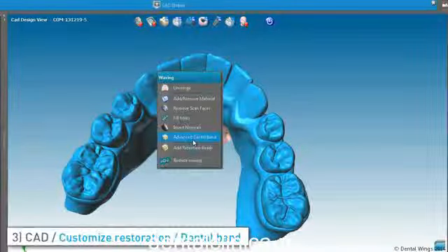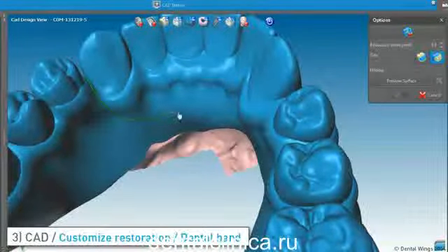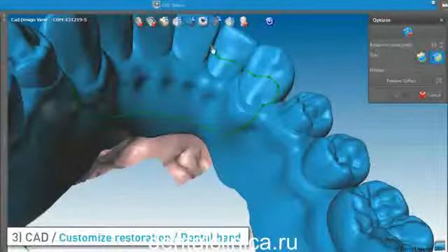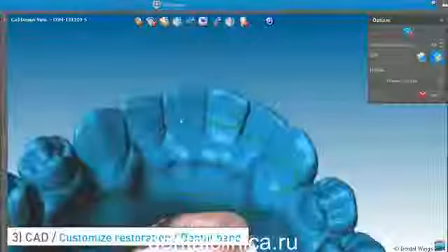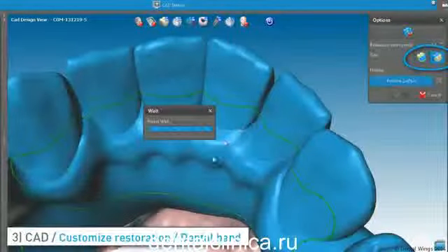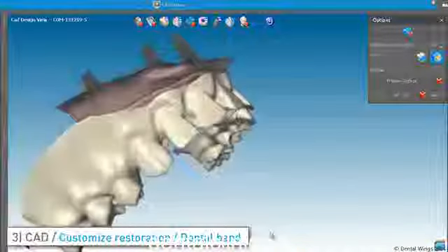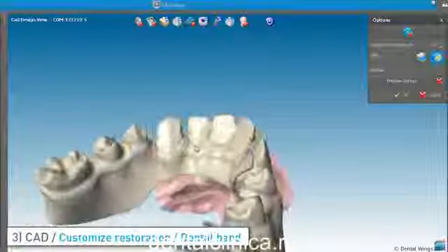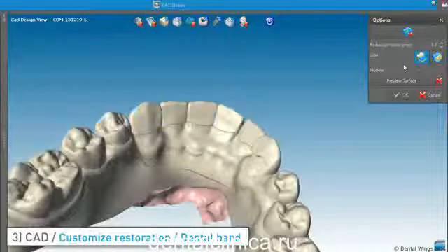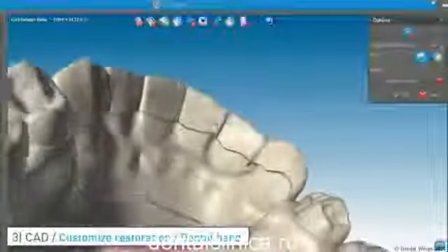Here is how you can apply a dental band to a merged waxing. Draw a line to mark the reduction area. Define if you want the reduction to be applied inside or outside the contour. Here, we have selected the outside icon, so everything other than what's inside the selected area is reduced by 80 microns. On the other hand, if you select the inside icon, the line you draw circles the reduction.